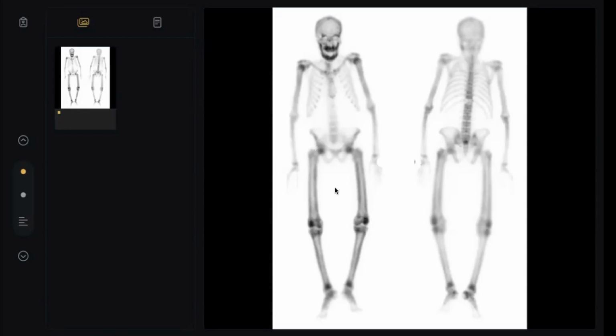As I told you many times, look generally and choose which pathway you will run within. This is not a localized uptake. This is generalized, so you are talking about a general systemic disease. That is in your mind. You will start from the absence of the kidney to tell the examiner it is a super scan. And you will tell him, doctor, the uptake is mainly peripheral. By the way, there is some uptake in the spine, but mainly peripheral and symmetrical, and no expansion.